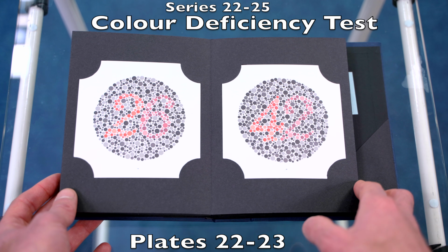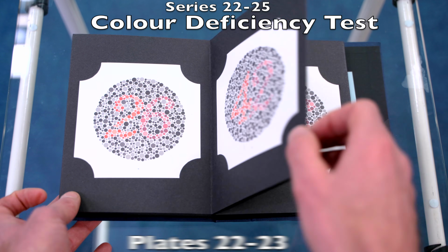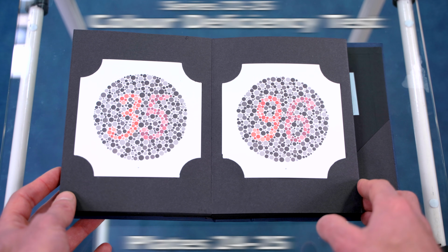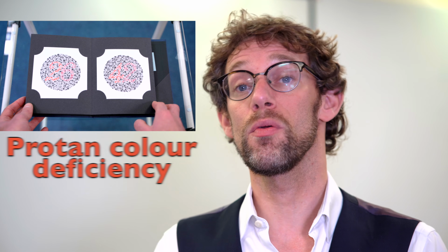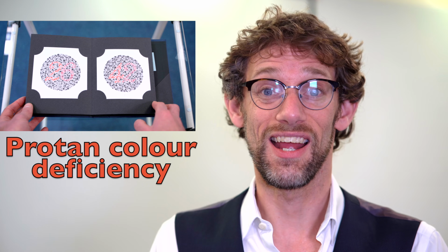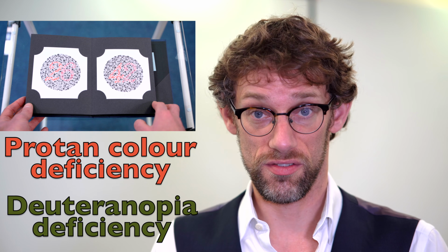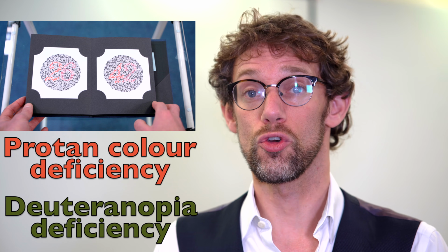22 and 23. 24 and 25. So these plates 22 to 25 will allow us to determine whether or not you have a Protan colour vision deficiency, i.e. a problem with the red cones, or a deuteran colour deficiency, i.e. a problem with your green cones.